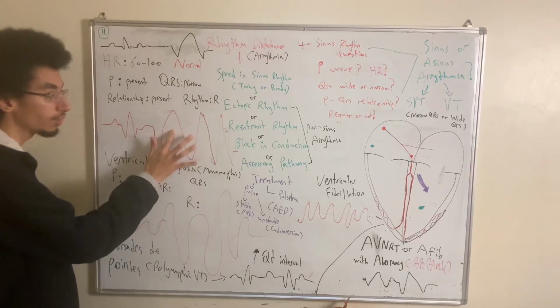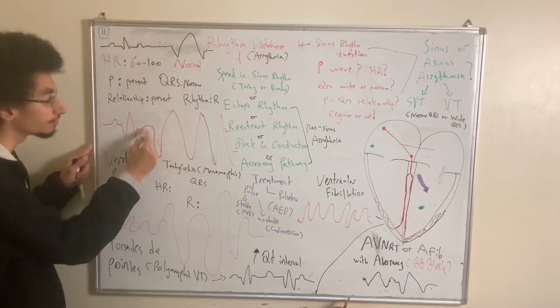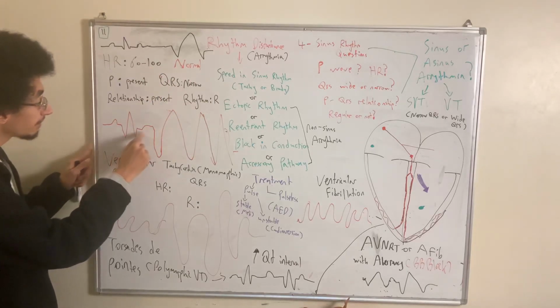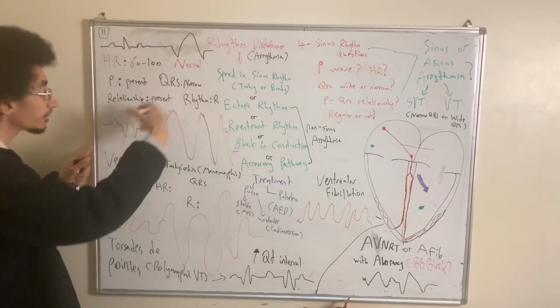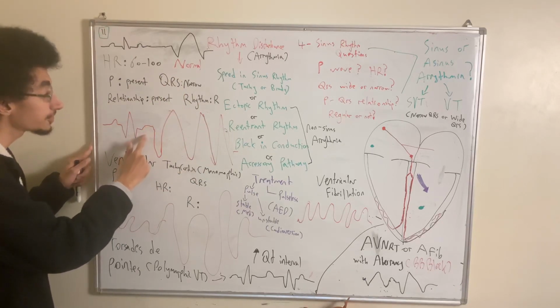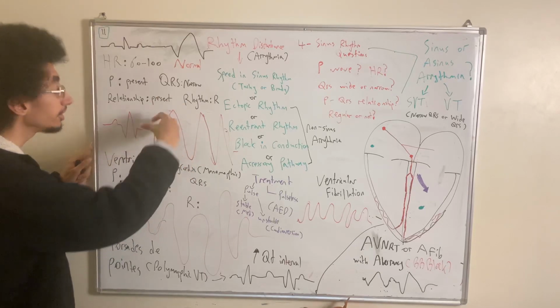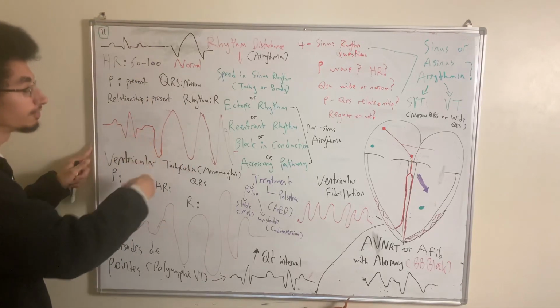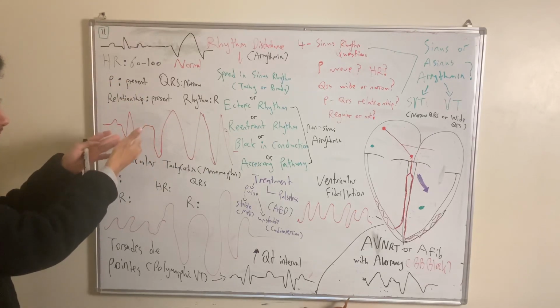If you see the R wave of a PVC fall on the T wave of a previous beat, you have a T wave of a previous beat in which this PVC jumped on top of it. It occurred on top of it. If you see the R on T phenomenon, where the PVC is literally within the T wave, it starts as soon as before this one finishes repolarization.